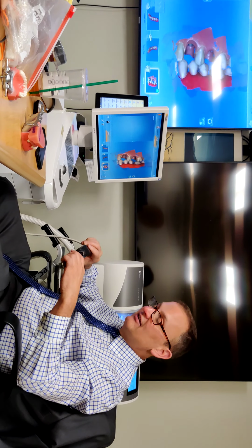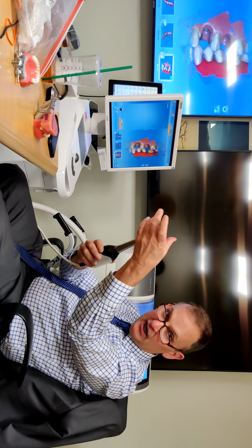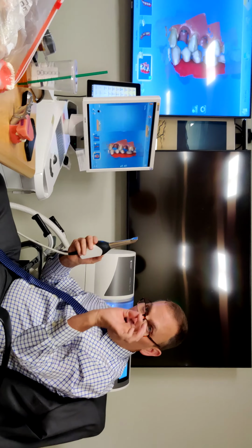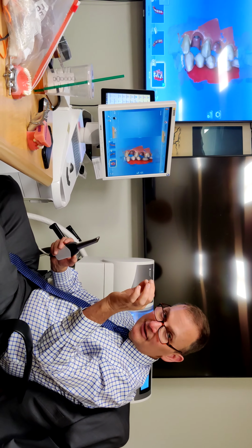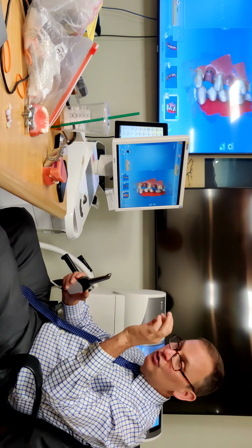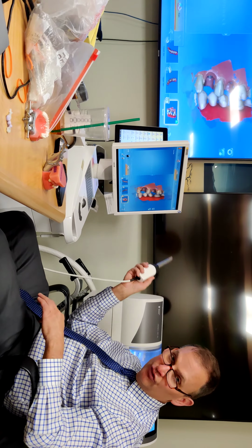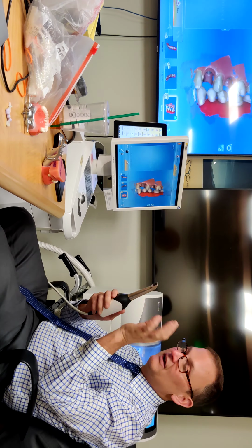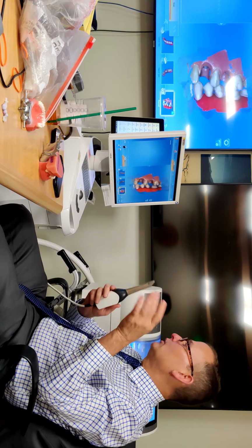The other thing is they sell a plastic cover, and it's disposable. Have y'all seen those? Yeah, we have it. Those are fine, except you can't full arch scan with them. And if you wanted it to pick your shade, you can't do shade selection with that plastic on. So you have to take the plastic off, and then these need high level disinfection, or wrap it with plastic or something, and then wipe it, whatever y'all's protocol is.